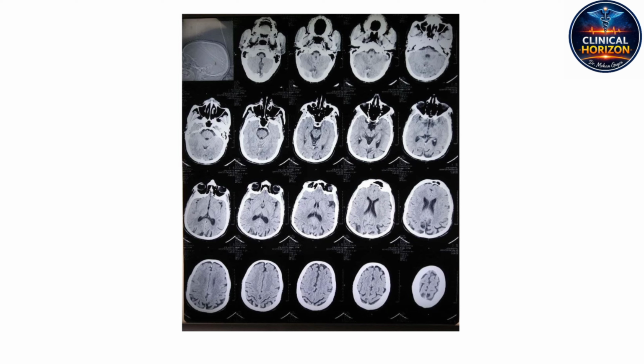What's fascinating here is that this image of flawless symmetry is your most important diagnostic tool. Because it sets the standard. Exactly. You cannot spot the abnormal until that perfect anatomical map is burned into your visual cortex. Radiologists are constantly hunting for deviations from this baseline. Like hyperdense regions, the bright white spots indicating acute hemorrhage or calcification, and conversely, the dark hypodense regions suggesting edema or infarction. Without a deep internalized understanding of exactly where the sulci should lie and how the ventricles should align, identifying early pathology is essentially impossible.